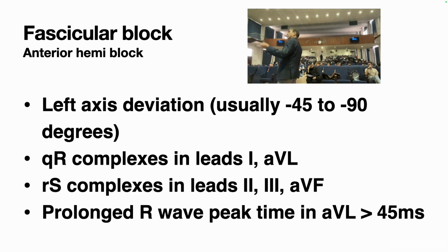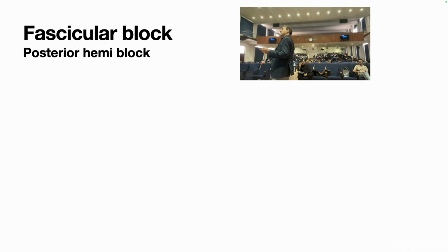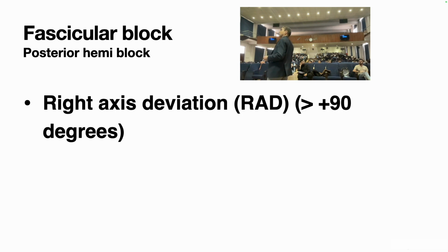You just forget all these things. Then posterior hemiblock: if the complexes are broad and there is right axis deviation, this is posterior hemiblock. Now, why are these hemiblocks important to remember?